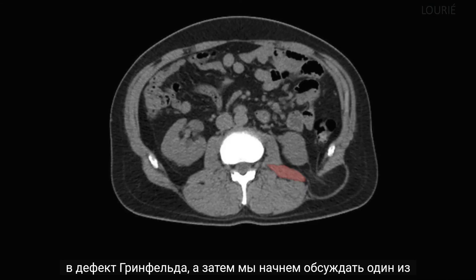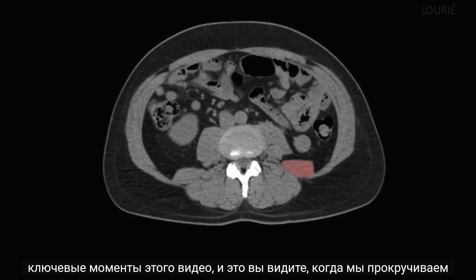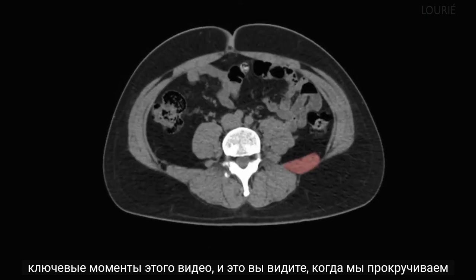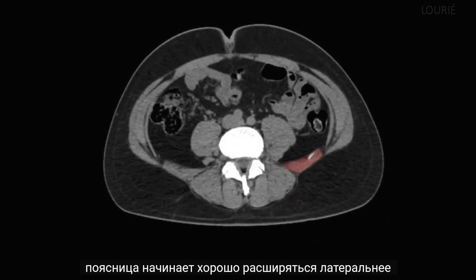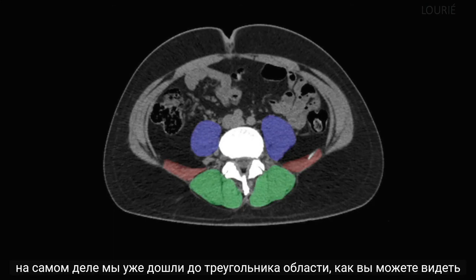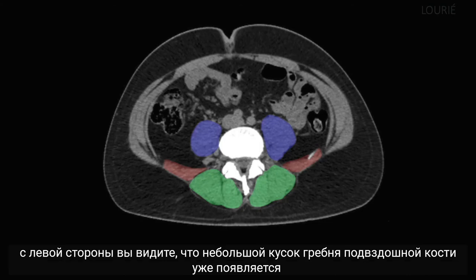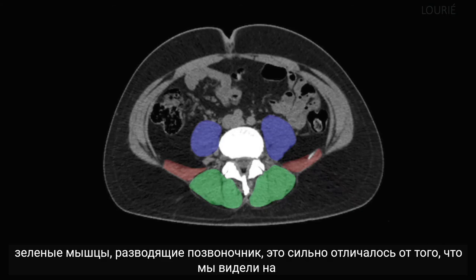the Grinfeld defect. Next, we will begin to discuss one of the key points of this video, and that is, you see, as we scroll inferiorly toward the iliac crest, the quadratus lumborum begins to extend well lateral to the border of the green erector spinae complex. In fact, we're already down to the area of Petit's triangle, as you can see. On the left side, you see a little bit of the iliac crest already appearing. Look how far out the red quadratus lumborum is extending compared to the green erector spinae.